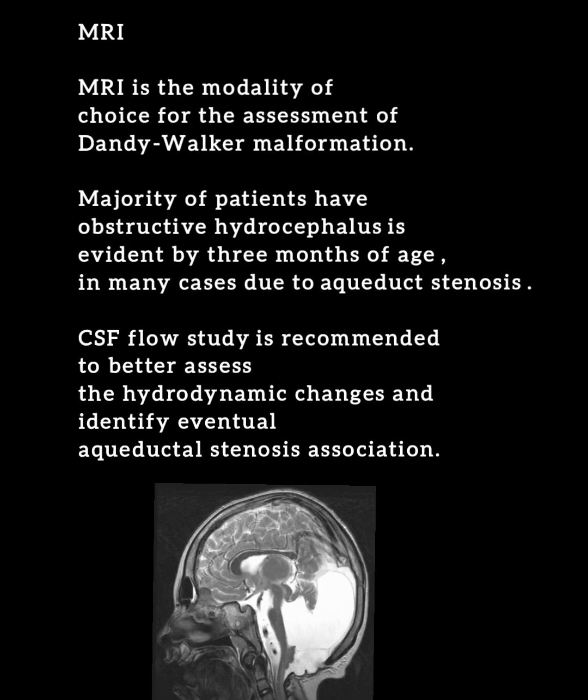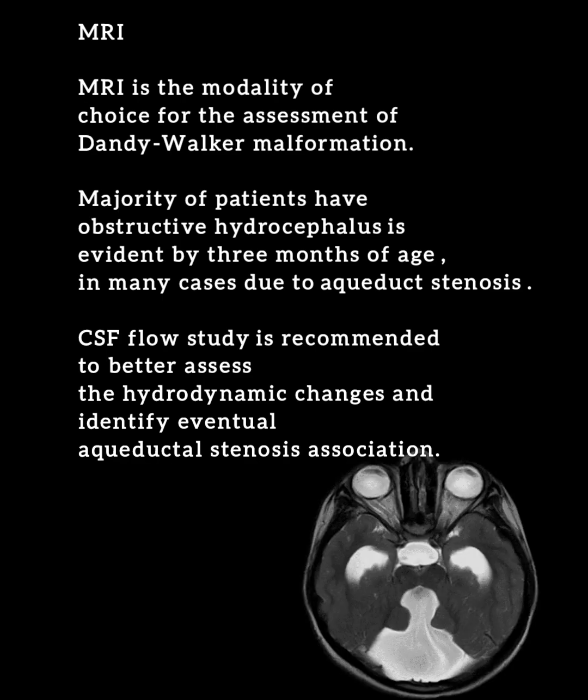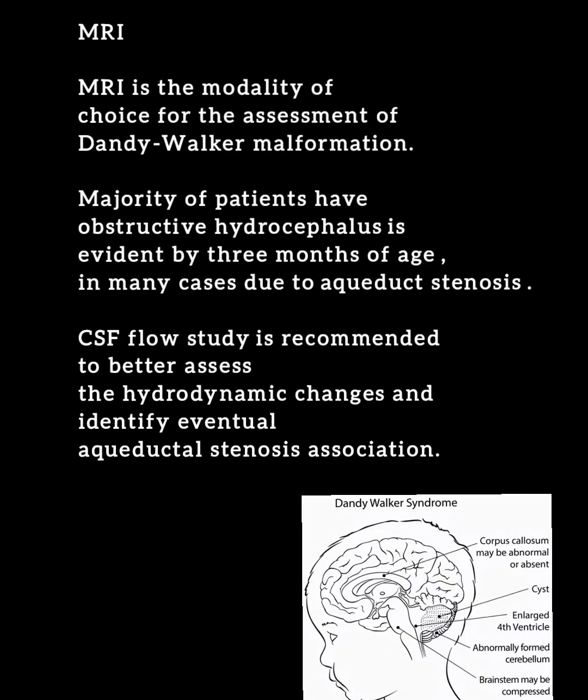MRI is the modality of choice for the assessment of Dandy-Walker malformation. The majority of patients have obstructive hydrocephalus evident by 3 months of age, in many cases due to aqueduct stenosis. A CSF flow study is recommended to better assess the hydrodynamic changes and identify an eventual aqueductal stenosis association.